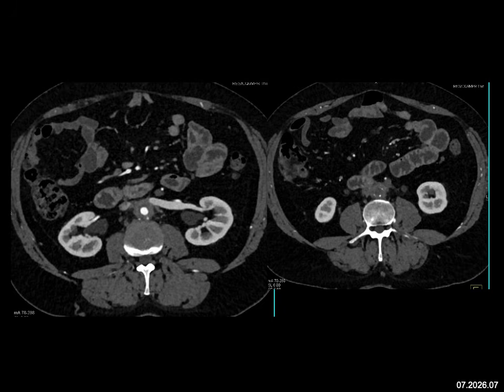It's not septic embolism. You could think about lymphoma, but that doesn't occlude the aorta, and it would be probably treated lymphoma. Lymphoma involving the aorta often displaces it off the spine, and it's much more bulky. This is a classic case of retroperitoneal fibrosis. Soft tissue encasement can involve the renal veins and ureters, constricting them, but also occlusion.